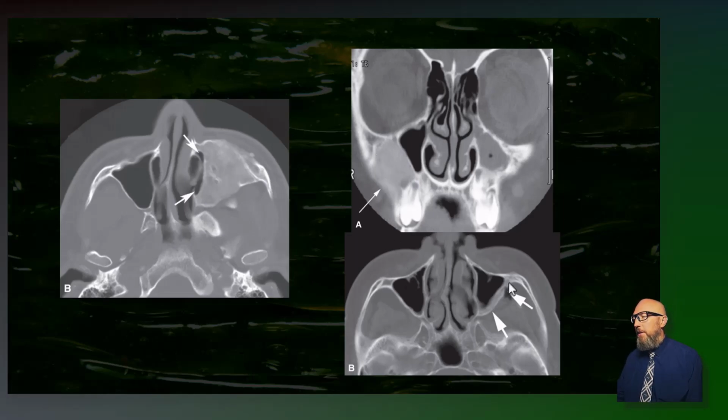Then what's different about this one here? Is that fibrous dysplasia? Is it like these, just kind of growing from the bone into the sinus, or is this more just the thickening sclerotic bone? Yeah, this looks like your typical sclerotic bone of chronic sinusitis. So a little comparison there.